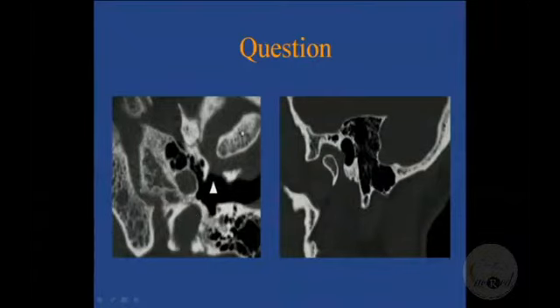It's foramen tympanicum. It's a fairly common anomaly. It's almost like 2 to 3% of the normal population. You always see it. It's very common, to an extent that sometimes I don't even mention it in the report. You just see it.